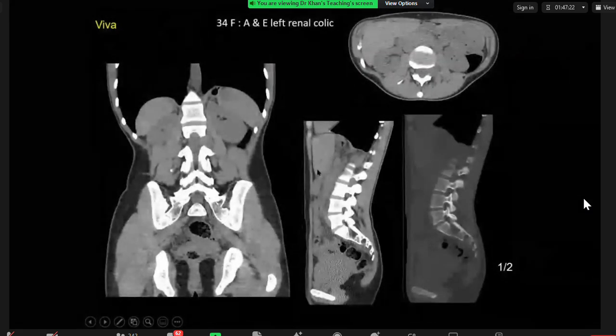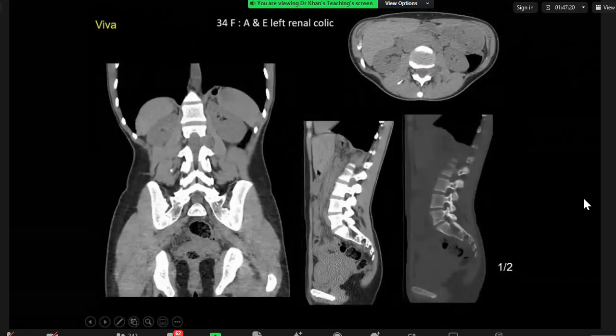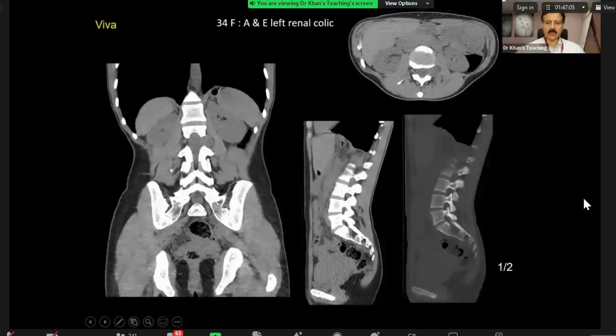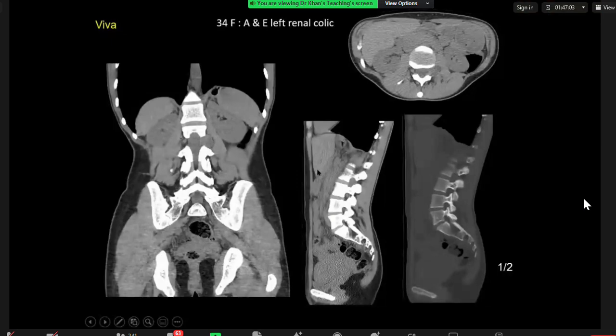So there, in the axial single image, there's expansion of the foramina on the left. And what will you be worried about? So in this situation, it will often be a neurally based lesion, a neurofibroma, or a schwannoma. What will you like to do? I mean, if we have a patient still on the table, I can advise a CT with contrast. Otherwise, MR.